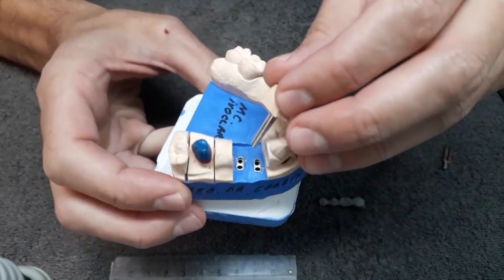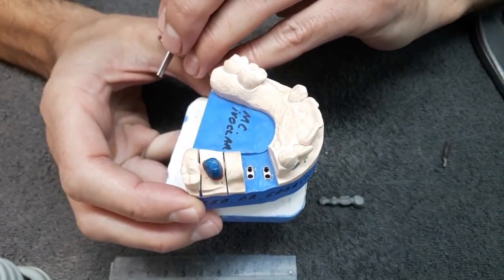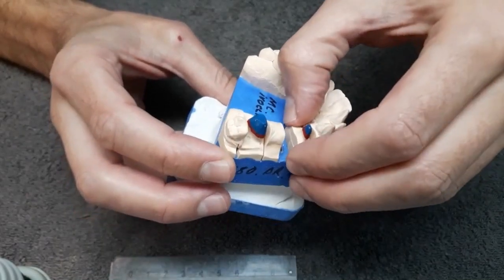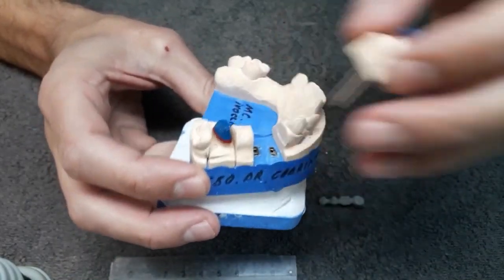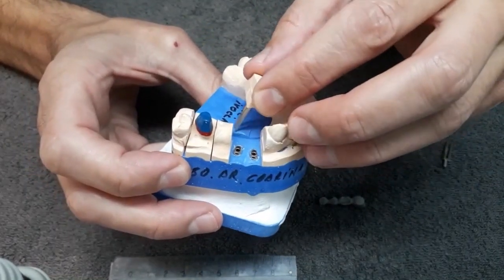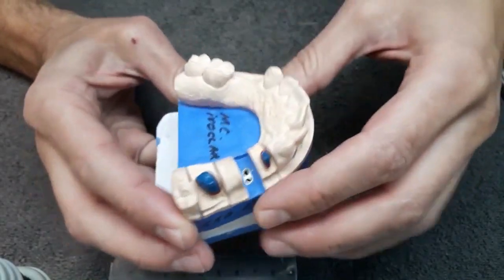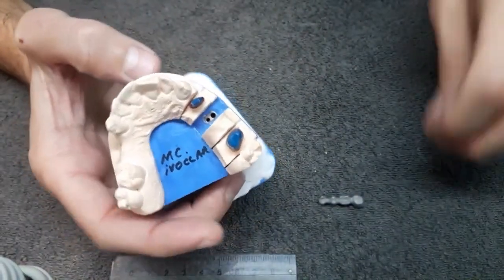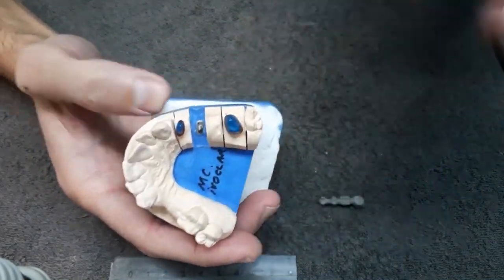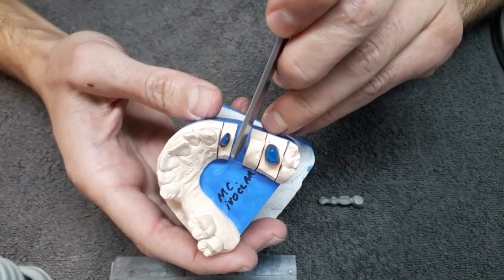base, so there is no possible movement of rotation or whatsoever. The stability is really perfect. So it has only one position on the model, really. This type of model, you have to pay more for that.